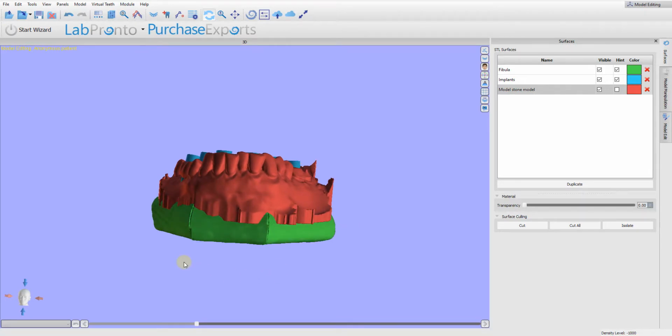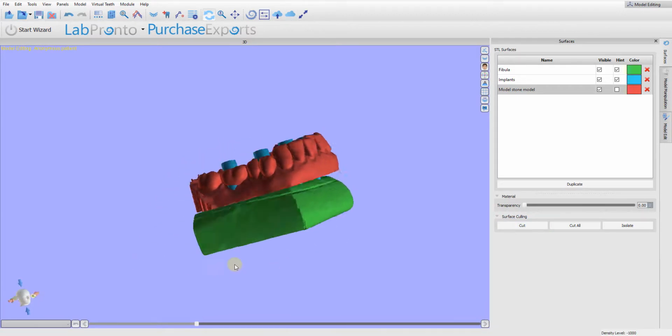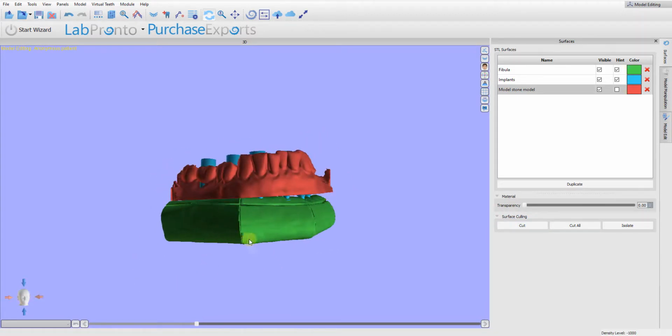prosthesis. So what we're doing actually for the lower prosthesis, we're simply cloning his original teeth that are going to be removed to give him back the bite that he started with. And with this red chosen here, I'm going to go to this cut tool, and I'm going to draw a line across here to see if we're a little bit above the fibula where we should be. And we need to be a little bit more.